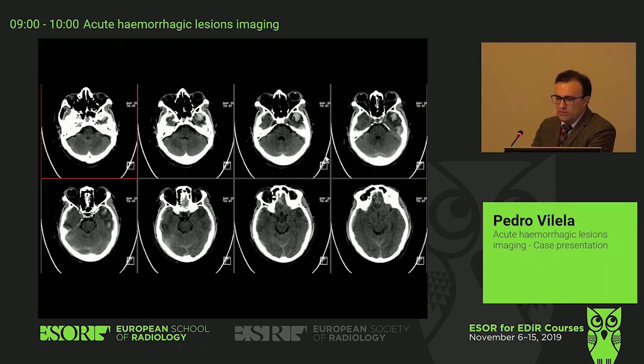Are there more? So we are going to see here that we have hemorrhage in different compartments. So we have brain hemorrhage, you have one there, another one here. And typically of the temporal lobe, where it impacts the bone at the middle cranial fossa and at the sphenoid ridge. There's also on the right side, a little above the tegmen tympani. Here?